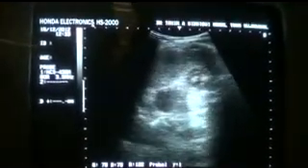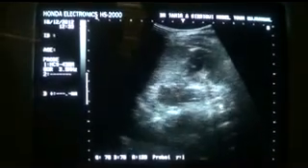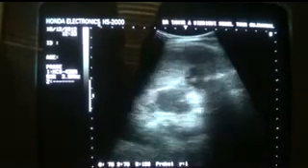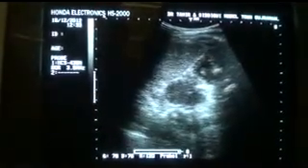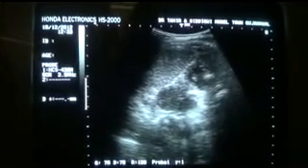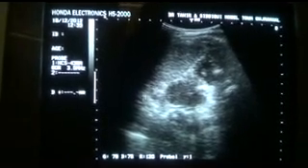It shares the capsule of the kidney, glides over the iliopsoas muscle, and this is very much consistent with an abscess formation at the upper pole of the left kidney, which is sharing the capsule of the left kidney.